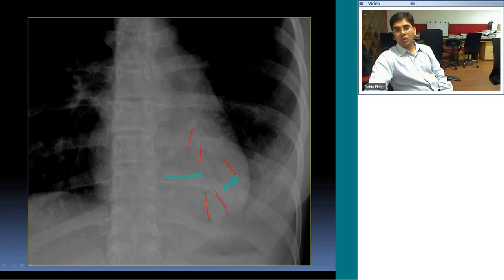In this patient, he came with fever and cough. You can see this homogeneous opacity here. The left hemidiaphragm is obscured. The left CP angle is also obscured. And then there is pleural effusion. So this is a classic case of left lower lobe pneumonia with parapneumonic effusion. Even sometimes with atelectasis, you may see the same findings. So you have to correlate with the clinical findings, that the patient has got fever and all. So most probably you're dealing with pneumonic consolidation and treat accordingly.